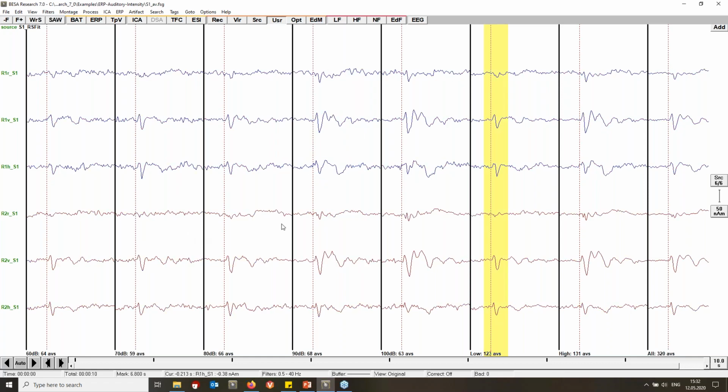So the regional sources, especially when we get to higher intensities, we can see that there's a lot more going on. In particular, when analyzing this experiment in more detail in another tutorial, we figured out that there is a third source that comes into play at high intensities, and this disturbs or overlaps with the primary auditory sources.